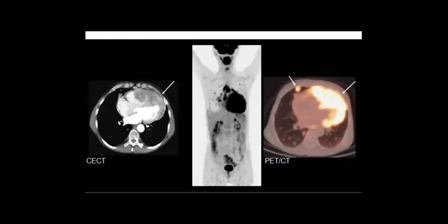Yes, Asma. But as we know, in general, the cardiac uptake is very high. But you can see that here in the CT there is thickening and there are soft tissue masses involving the septal wall. So sarcoma or angiosarcoma would be a good differential.